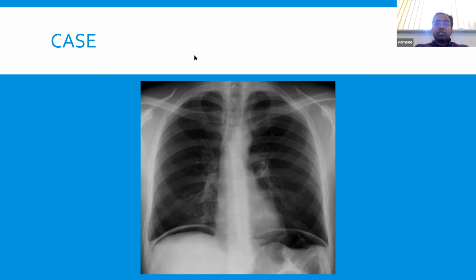Which is a very good presentation. Absolutely like that. You've clearly done this sort of practice quite a lot previously. I just wanted to ask, following on from that, what would your next step be if you see a chest X-ray like this?